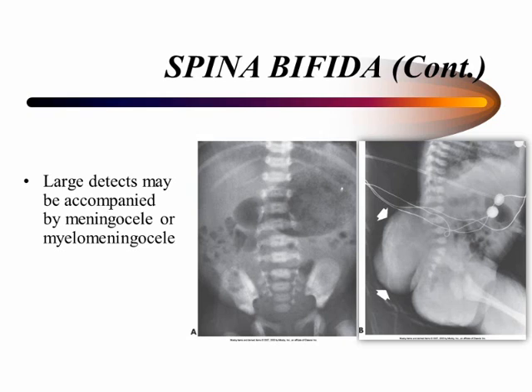Spina bifida lesions are associated with large bony defects, absence of the laminae, and increase in interpedicular distance. The herniated spinal contents are seen as a soft tissue mass posterior to the spine. Myelography, CT, or MRI can demonstrate the presence of spinal cord or nerve roots within the herniated sac. Prenatal real-time ultrasound can demonstrate the serious malformation in utero on sagittal spine fetal images that determine the location and severity of the deformity.